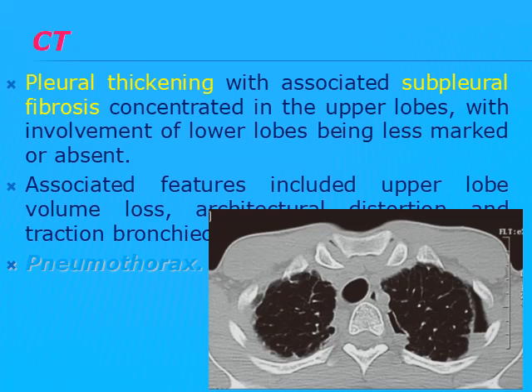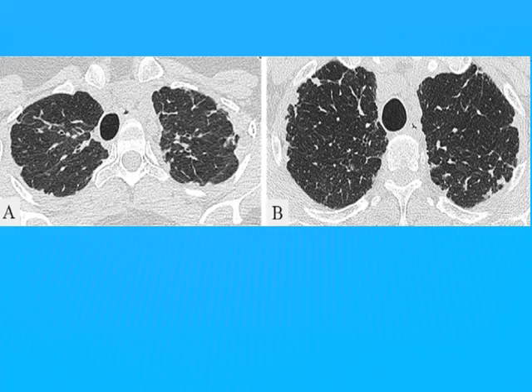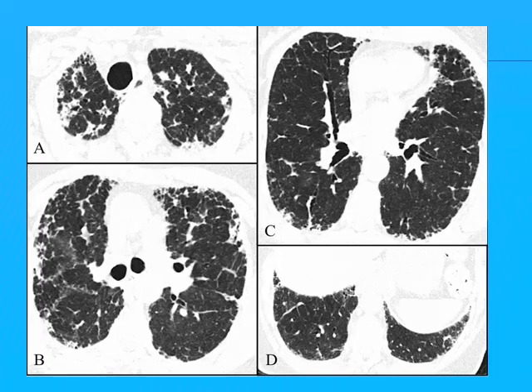If the clinical situation is correct, we can diagnose pleuroparenchymatous fibroelastosis. Again, fibrotic bands in the lung apices with pleural thickening. Actually, in the old days, we usually called this upper lobar scarring secondary to old TB. And keep in mind that the patient should have the corresponding typical clinical presentation, platythorax, and on follow-up, this process is progressive.